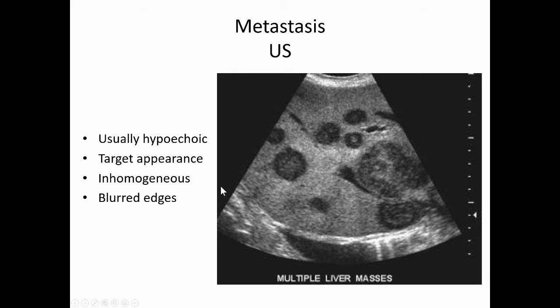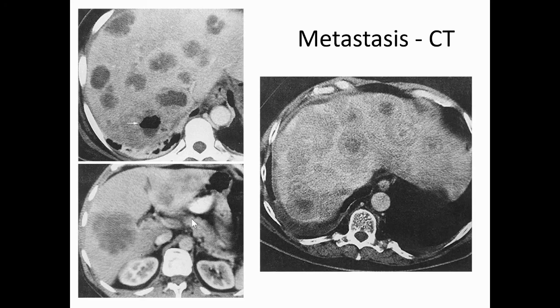And when you see something like this on ultrasound, it's quite gross, because these livers are usually quite large. You can actually palpate them, and these nodules make the contour very wavy, and it's a little bit gross to touch.